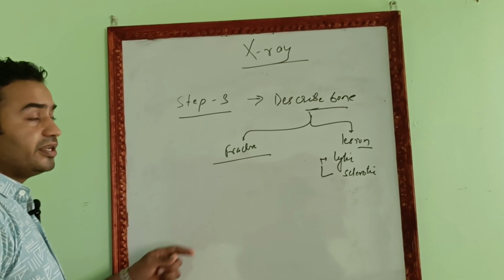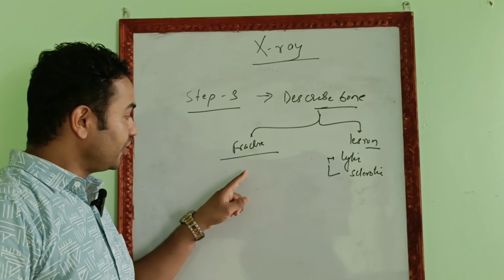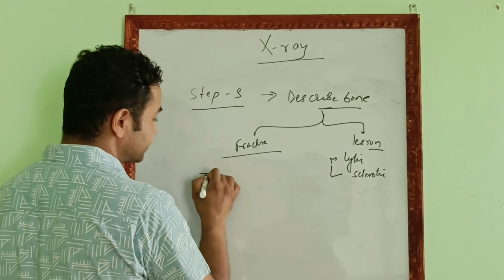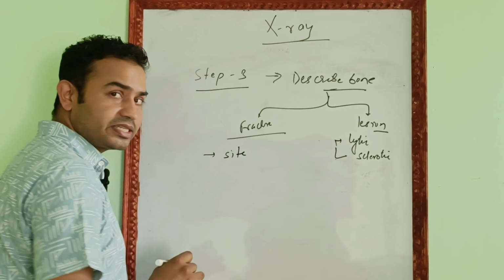In fracture, while describing the fracture, I'll try to explain in more detail. We have to describe the fracture site. Where exactly is the fracture?